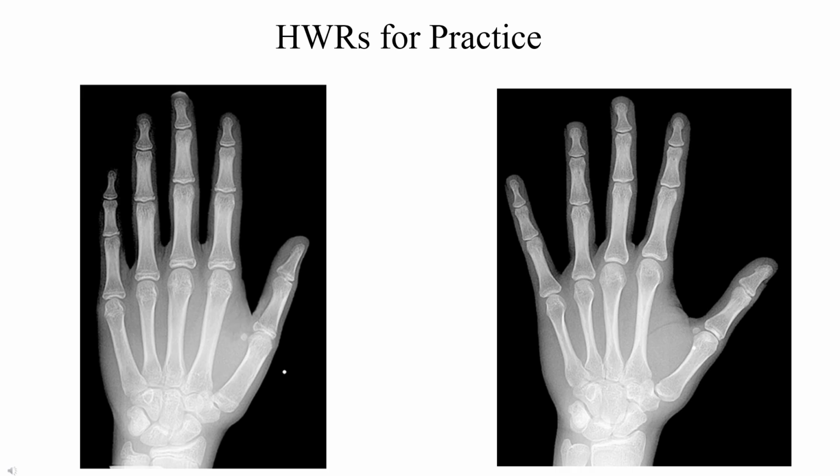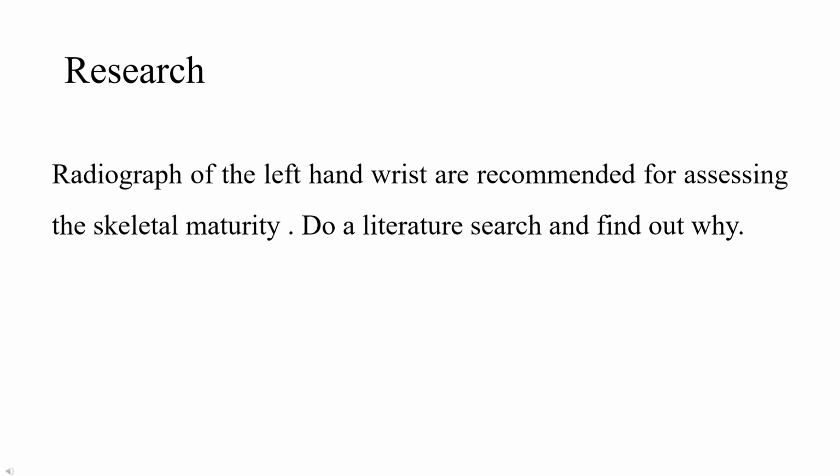Take a screenshot and try to assess the skeletal maturity. And time for some extended learning. If you are an inquisitive one, find out why radiographs of the left hand-wrist are used for assessing the skeletal maturity.